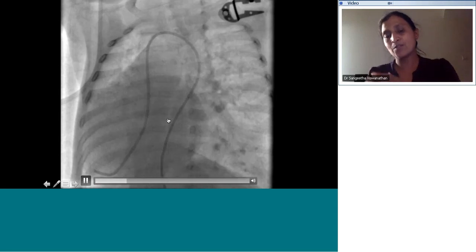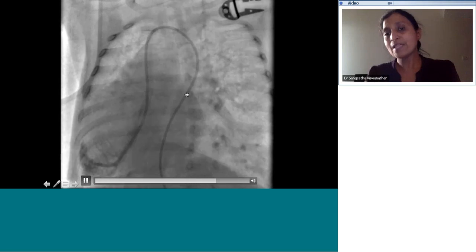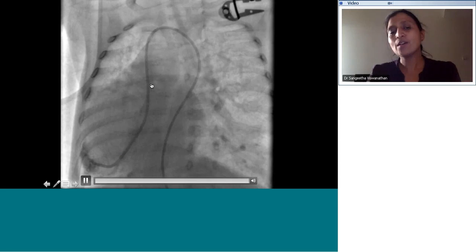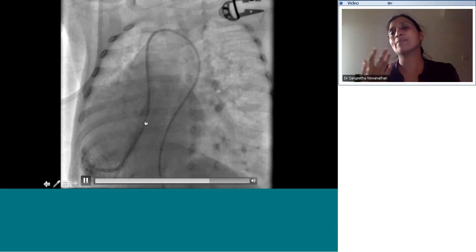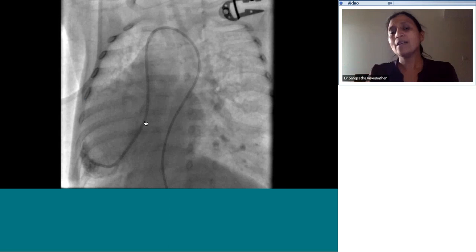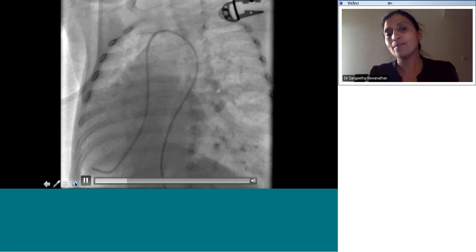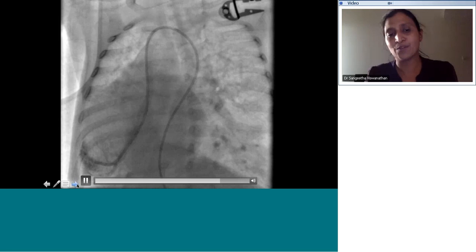Situs inversus and dextrocardia, which is why the RA is on the left. The SVC is inverted, so it is a LSVC with right innominate. Into this right innominate, there is drainage of an isolated right lower pulmonary vein. So this is partial anomalous pulmonary venous drainage in a patient with situs inversus and dextrocardia. Okay? I hope that is clear now. So it's just an inverted, inversus type of situation. That is why it's confusing to you.